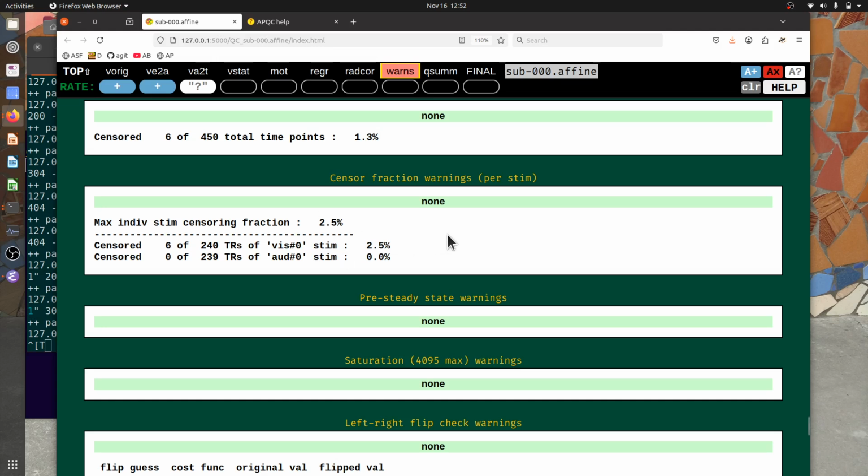That doesn't appear to be problematic, but as you have event-related designs in particular, or really any stimulus type, when you have a very high fraction in a particular stimulus class, you're going to run into mathematical problems of trying to correctly model it and get a reliable result.